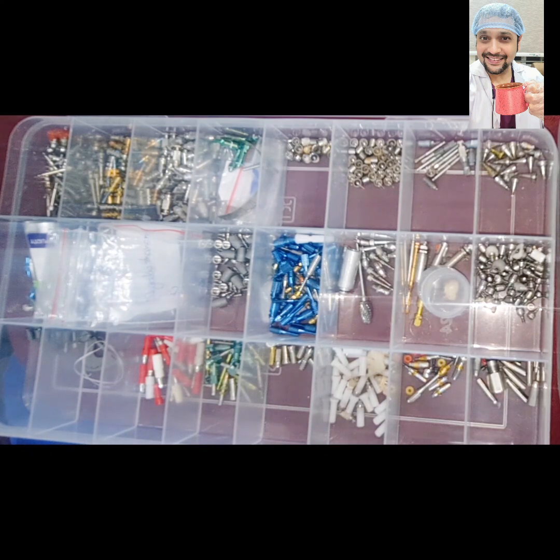It is not one single unit that is going to sit on. So all the MUA level prosthesis would be screw retained prosthesis on which the basic framework is screwed onto the MUA, and then you can either use layering in the form of ceramic or a superstructure that lutes over the framework. So this is all about it.